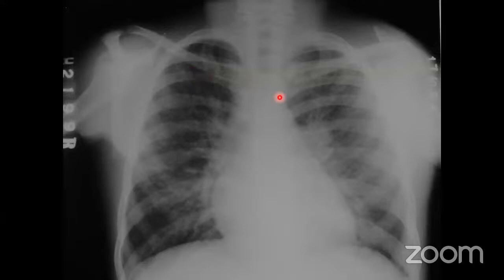This time I am showing you this X-ray because this X-ray will teach you many things. If you look carefully, the whole lung appears hazy. And there are some straight lines coming from the apex to the hilar. So we call it Kerley A line. If you go to the right side, there are a few transverse lines.